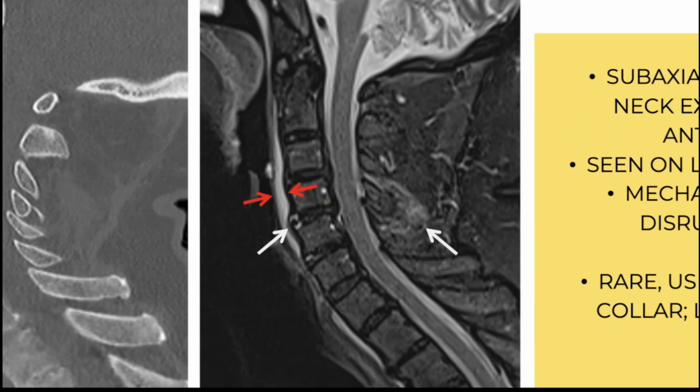And you can see that because it's in between two different densities. So it's between air and bone, and soft tissue is different to that. If you have something abnormal in there, then you'll get more excessive thickening of that area, which is abnormal. This is the MRI correlate of that, and this is actually hematoma or blood products in that prevertebral space.